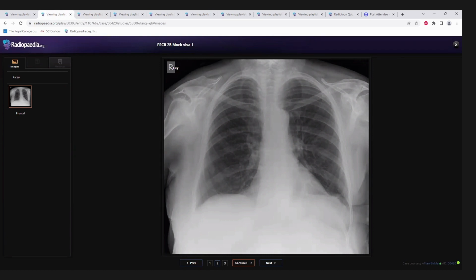And because I know the case, it was easy for me, but you finally did pick up a lucent lesion in the anterior aspect of the right rib. And I would compare it with the clinical history, and the patient would require a restaging and referral to breast oncology, MDM, for further management.